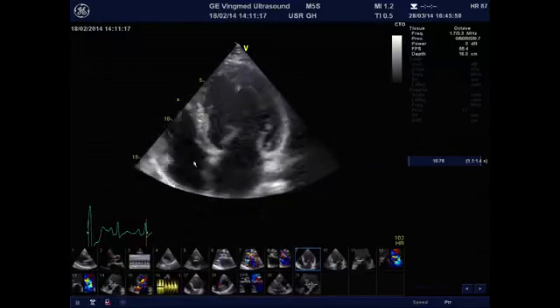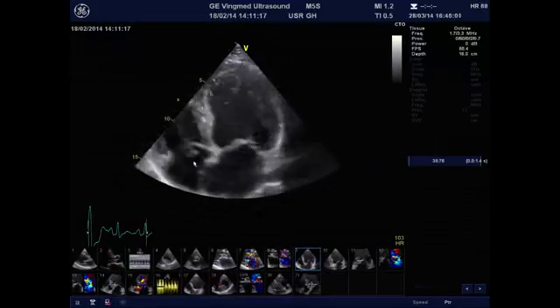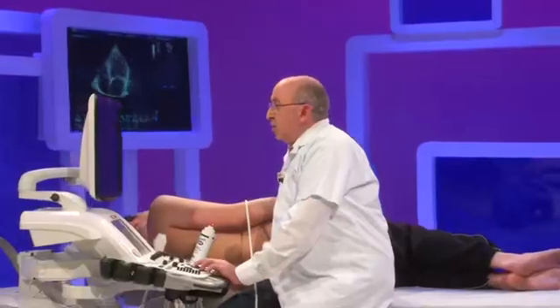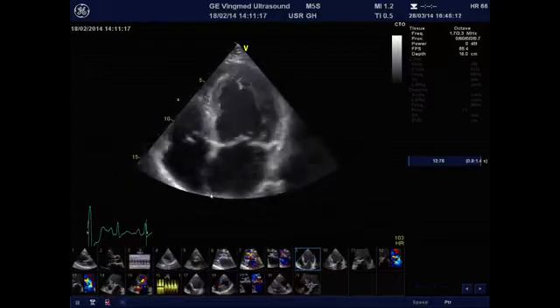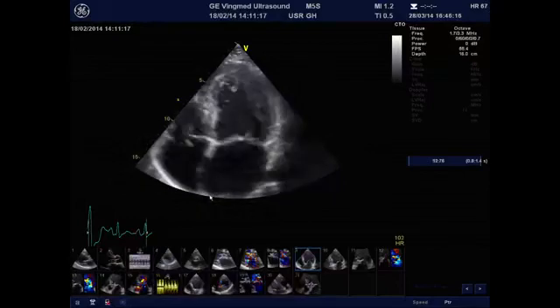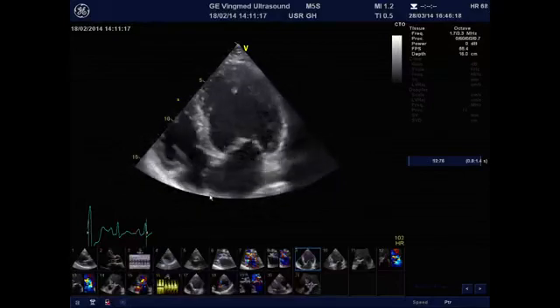And what I would say here is that it is difficult, only with the use of echocardiography, to differentiate between a vegetation and, for example, a tricuspid prolapse. So now the first step is done. We have a probable diagnosis of infective endocarditis because of a huge vegetation on the aortic valve, and also because we have a suspected vegetation on the tricuspid valve.